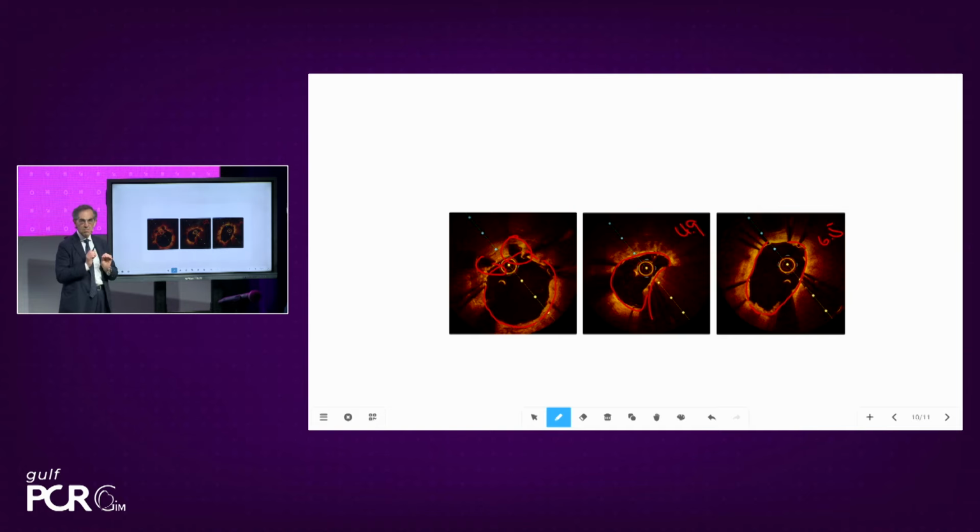When you have asymmetric calcification, this is the point where you are taking some risk to rupture the vessel. Asymmetric calcification is very relevant to get some information from the imaging. The nodule was not significantly impacted by this very aggressive technology that we have today, the lithotripsy, but perhaps it is not the only one in nodule preparation.